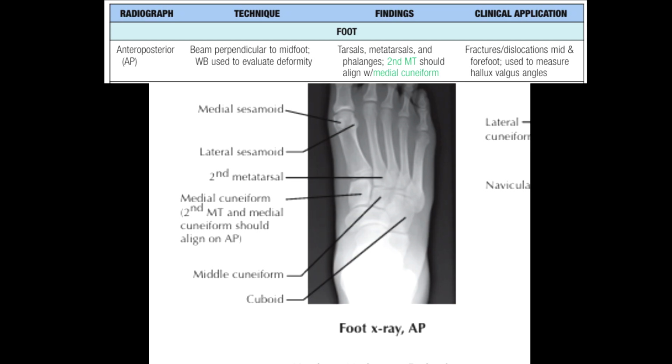Let us begin with the anteroposterior, or AP, radiograph of the foot. In this projection, the beam is directed perpendicular to the midfoot, and it is typically obtained with the patient in a weight-bearing position. The weight-bearing AP view is essential because it shows us not only the bones, but also the way the arches behave under physiological load.